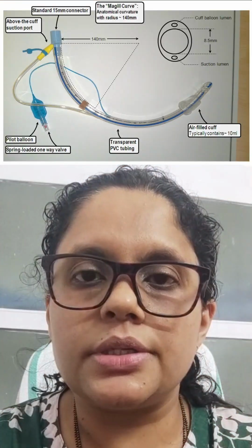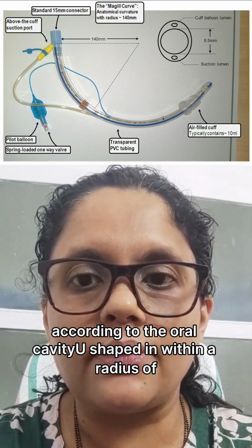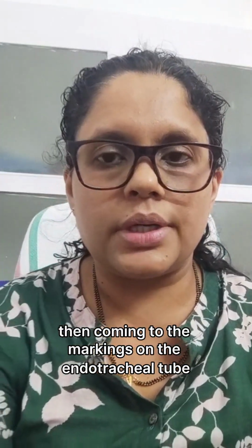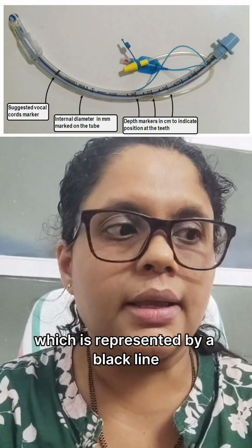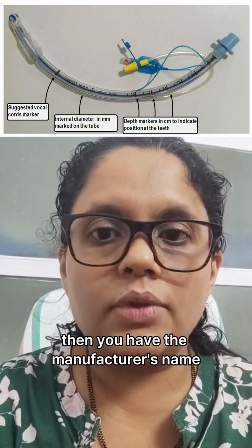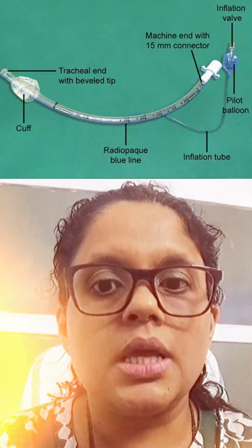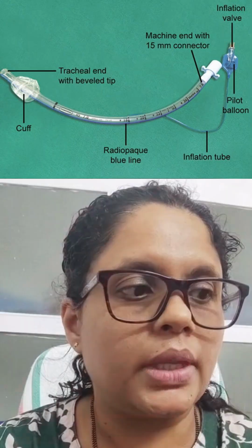Second comes the curvature. The endotracheal tube has an anatomical curvature according to the oral cavity, shaped with a radius of 140 millimeters. Then coming to the markings on the endotracheal tube, you have the level of the vocal cord, which is represented by a black line. Then you have a marking saying oral or nasal use. Then you have the manufacturer's name along with the internal diameter and external diameter in millimeters, and there is a radio-opaque line passing throughout the length of the tube.